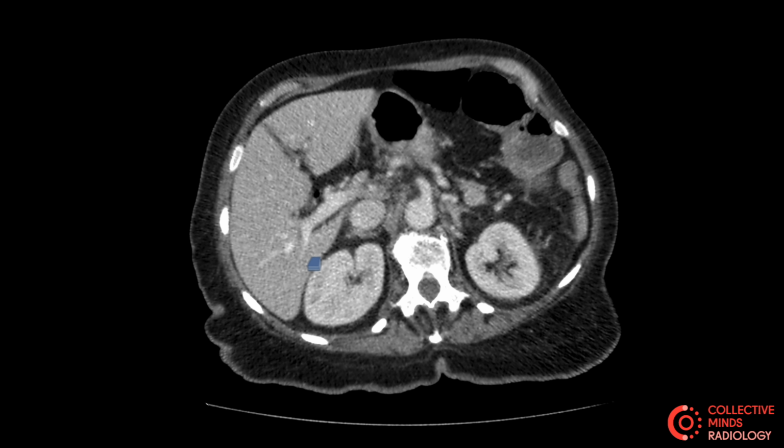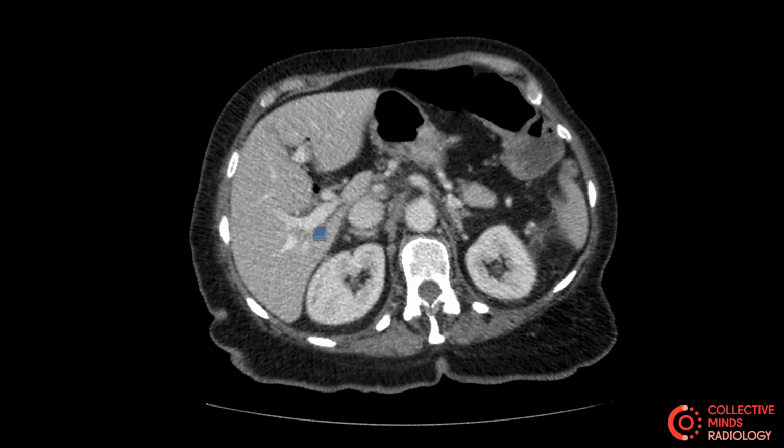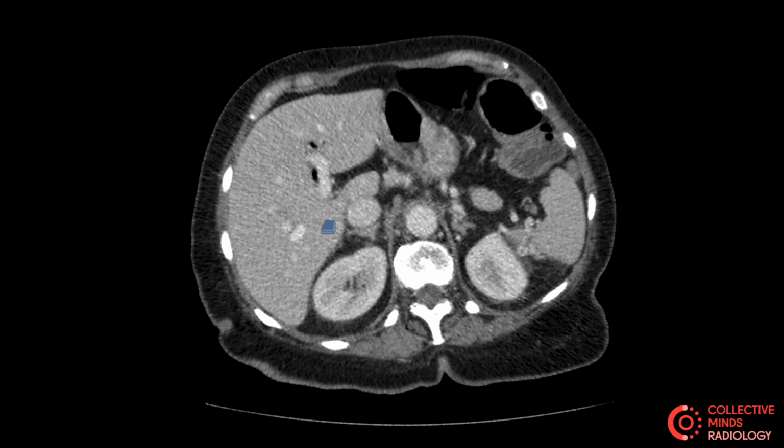And then if you look at the biliary tree, you can actually see there is some air within the biliary tree, so there's air within the intrahepatic ducts. So something's not quite right. This patient may have had a previous cholecystectomy. They may therefore have air within the biliary tree, but I'm telling you now, this patient has not had a cholecystectomy. So something is clearly abnormal within this region. So using our method, we've already discovered something is very, very abnormal with regards to the gallbladder.